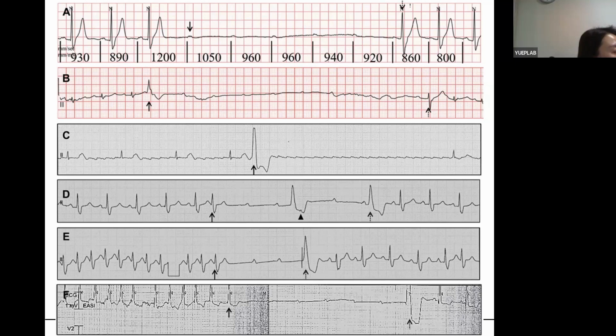But there's 2 consecutive blocks right there. Okay, 3. So maybe, considering yesterday's AV nodal conduction curve, the patient may have intrinsic AV nodal conduction disease as well. Who knows? Because your ventricular cycle is too long, 600 milliseconds. This surgical procedure sometimes damages the AV node and the whole nine yards, because they stretch and cause mechanical injury to the cardiac tissues there, especially putting a VSD patch so close to the AV nodal area.